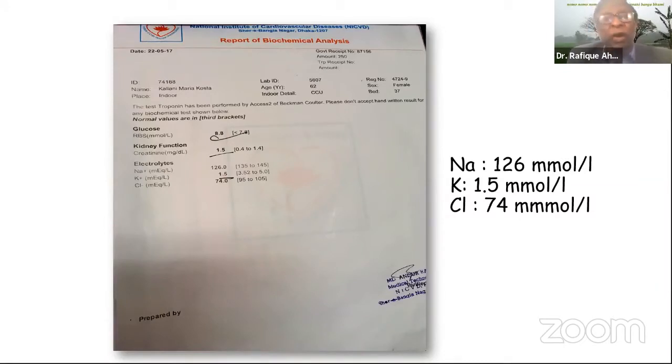The only problem in that scenario would have been if the patient does not maintain adequate therapy and then goes to hypokalemia again. So this is the problem. In this one, of course, we have a cause of hypokalemia, but still a potassium of 1.5 is very low. Even though we are thinking this is due to vomiting, we need to rule out other causes of potassium loss. Like maybe the patient has a potassium losing nephropathy on top of which vomiting developed and it became so low. And this is not a long QT syndrome because at that heart rate, it will be very, very difficult to assess the QT interval.